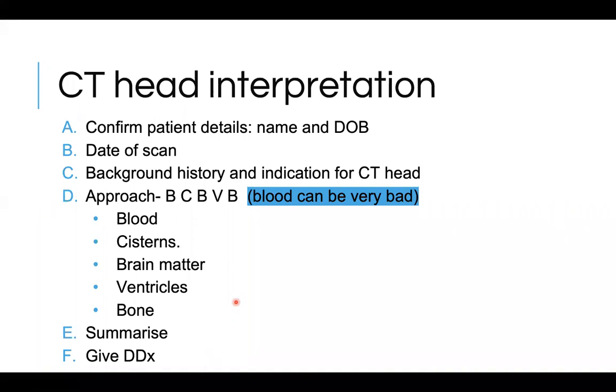And it's important to look at the date of the scan to also assess when it was taken, and this is relevant in terms of the background history of what's happened to the patient and the indication for the CT scan.